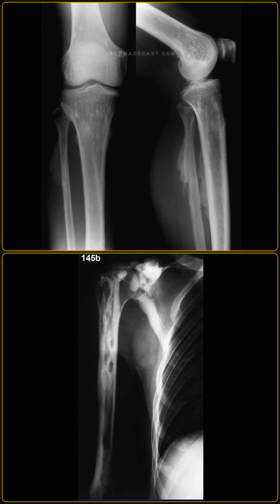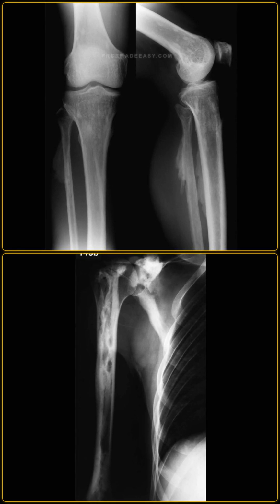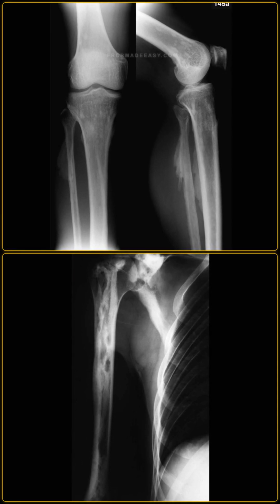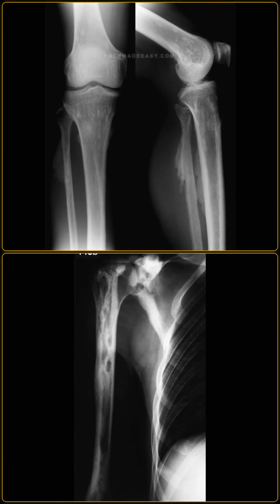What is the clinical significance of these conditions, and how would you manage this patient as a radiologist? The primary clinical importance of osteopoikilosis is that it can be mistaken for widespread osteoblastic metastases, or myeloma.